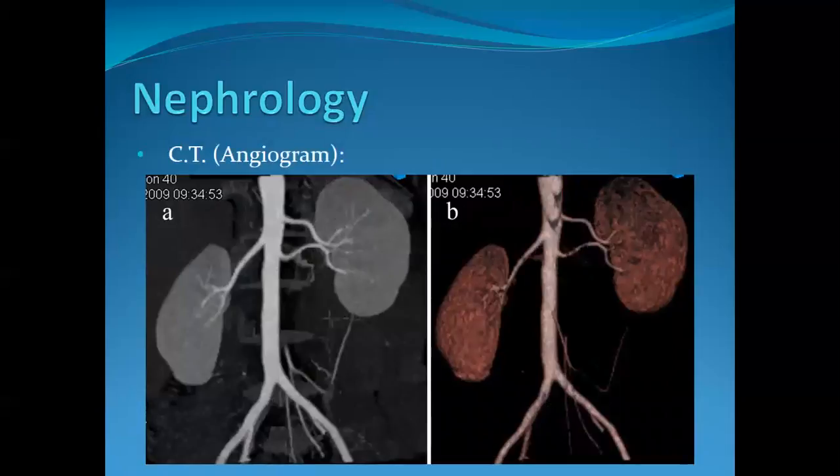This is an example of a CT angiogram, and you can see that it's just beautiful imaging. Here's the aorta. Here's your right renal artery, which is beautifully depicted all the way into the right kidney. Right kidney is a little bit lower than the left one because of the liver here. That's normal. And if you'll notice on your left side, you have 2 renal arteries supplying the left kidney. So you have an accessory renal artery on the left. That's a really common occurrence.